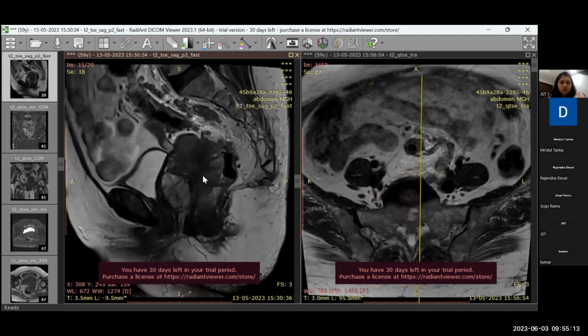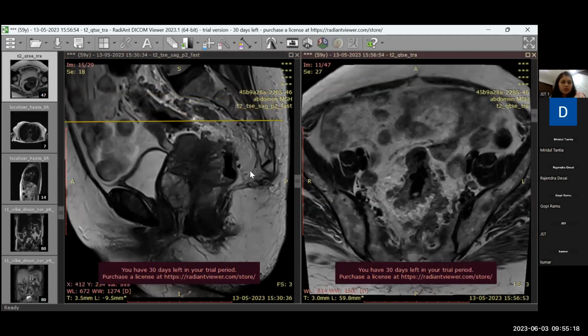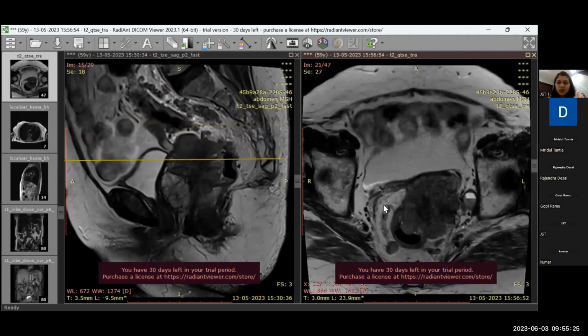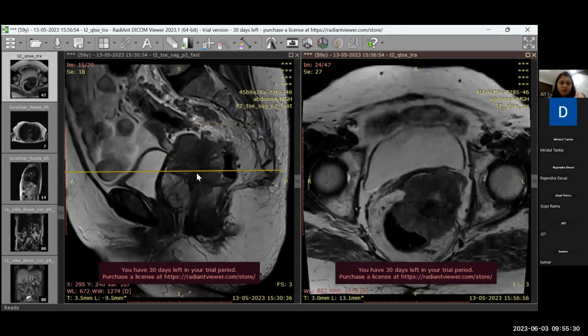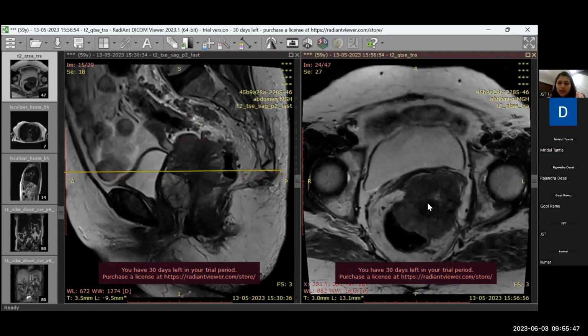So this is a large tumor. The patient is post hysterectomy. So the tumor is sitting on the, we don't know the epicenter, but because of the morphology and the EMVI extension and just seeing the epicenter of this tumor, it looks more like a rectal growth than a vaginal wall growth. We didn't get the follow-up of this patient, but this appears to be a rectal wall growth.